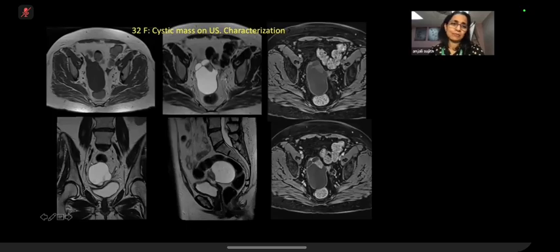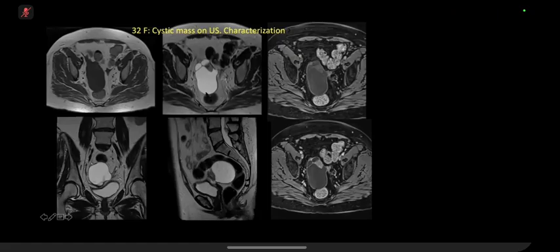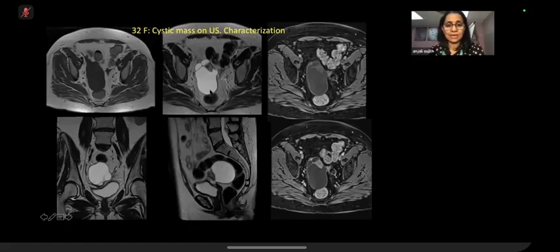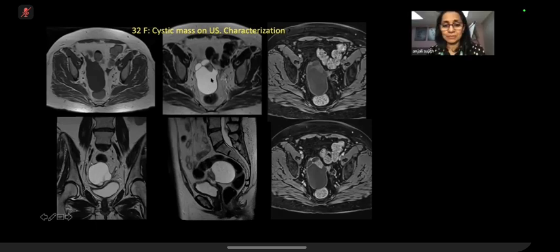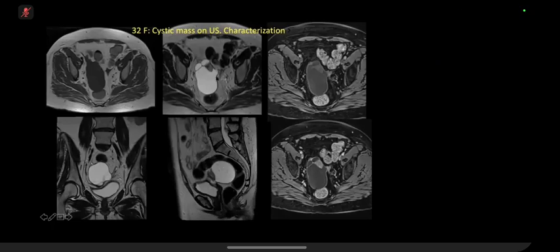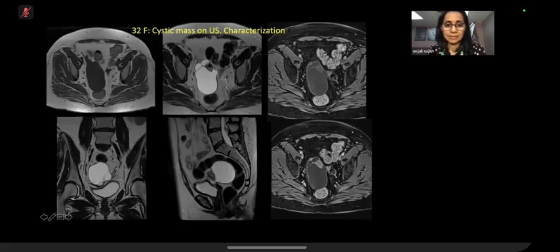I did not quite get what you were pointing at. I mean, unfortunately. Okay, let's start with the T1. I'm showing it. So this is a T1 low signal pelvic lesion. Yes, and it's high signal fluid signal on T2. And what else can we see on T2? Maybe there is a solid component inside the cyst. Yeah, there is an isodense or a solid soft tissue component.